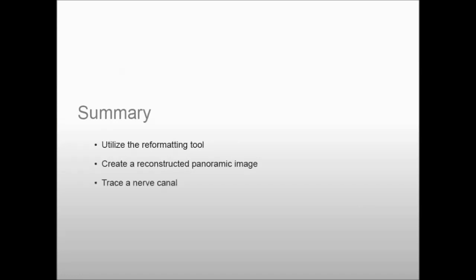Now you should be able to utilize the reformatting tool, create a reconstructed panoramic image, trace a nerve canal, perform measurements, and place an implant.